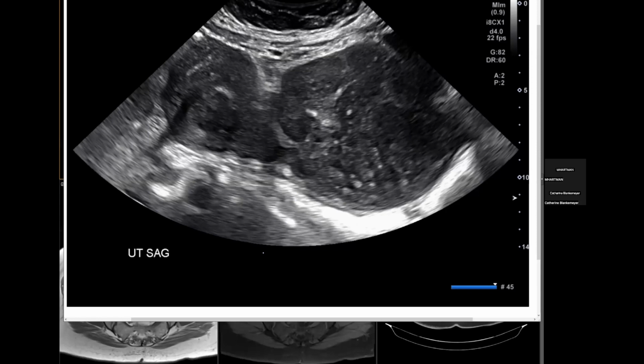Okay, this is Katie's rad path case that I'll be going through the imaging for. This was a 59-year-old female who had a history of pelvic pain. Also had a history of pancreatitis, which we'll be showing those images too on the CT. But I just wanted to show the ultrasound first, which we always say is the first modality anytime there's any pelvic symptoms, pain, abnormal bleeding. This is the modality to start with. And I agree with that.